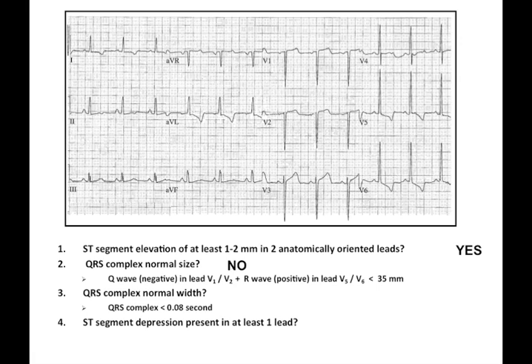Because we have answered no to this question, we cannot use this algorithm, and we cannot diagnose STEMI in the out-of-hospital setting. This ECG, in fact, does not demonstrate STEMI, but demonstrates ST elevation related to left ventricular hypertrophy. Isn't this fun?